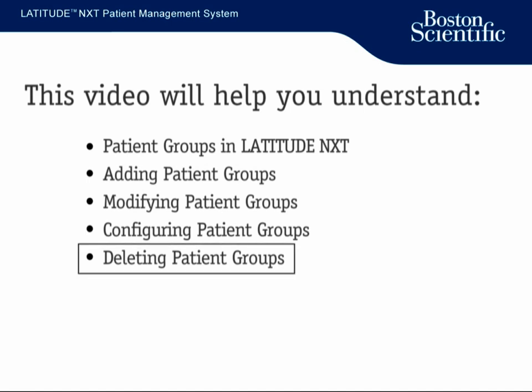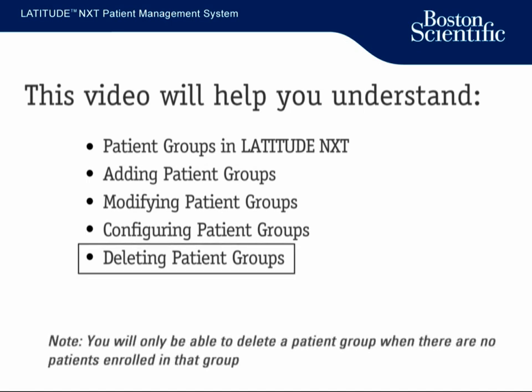Now we'll show you how to delete patient groups in Latitude NXT. It's important to note that you will only be able to delete a patient group if there are no patients enrolled in that specific group. If you still have patients enrolled in a group, you will either need to reassign those patients to different patient groups, or you'll need to unenroll them from Latitude NXT before proceeding.